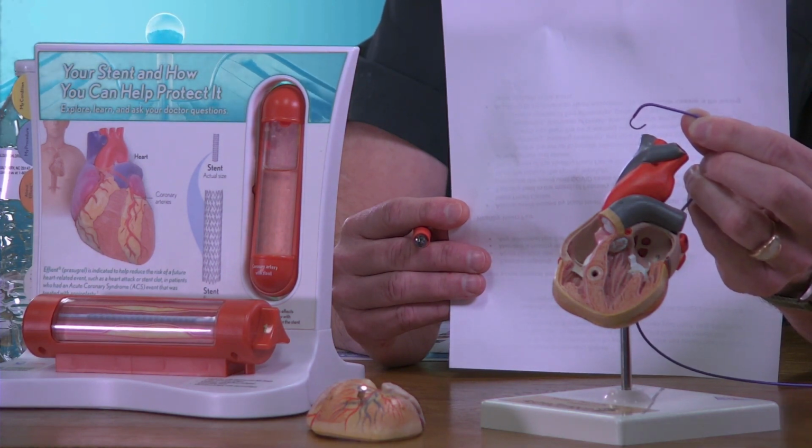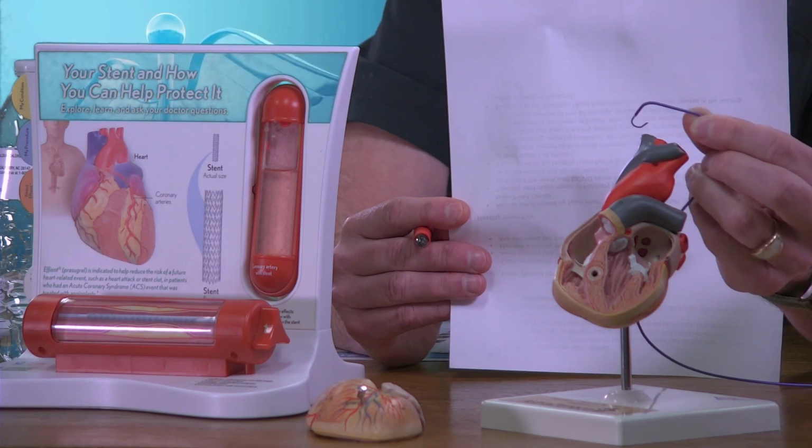Tell us what happens with a stent. So what the stent does is it's like a scaffolding that keeps the artery open. So it's a tube. It's a tube, yeah. All right. Do you have one of those with you by any chance? Let me see. Yeah. So basically, if the artery is hurt inside the tube, we can put another tube inside of that that's made out of a man-made material, and that holds the artery open so that the patient's blood flow will go through the artery and bypass the plaque or the damaged wall of the artery. Did I get that right? Yes. Okay.